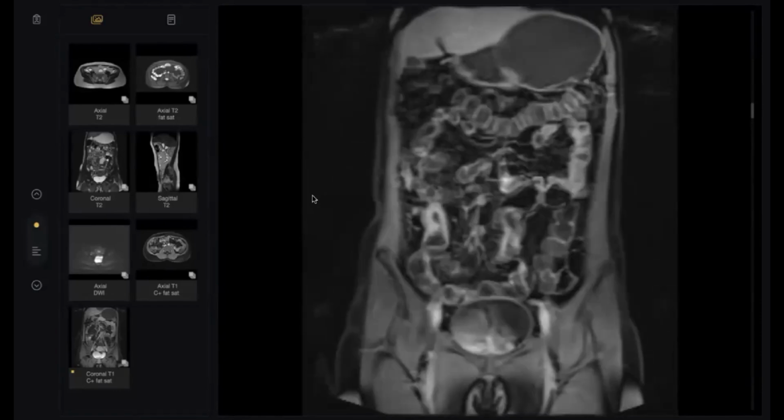Give me your final diagnosis. Final diagnosis is acute on chronic Crohn's disease with no active fistula, but with positive ileal inflammation and positive vasa recta, suggestive of acute inflammation. Next, I will advise correlation with the previous cases to see whether the same segments were involved, and also MDT referral to suggest the disease activity status and discuss further management.